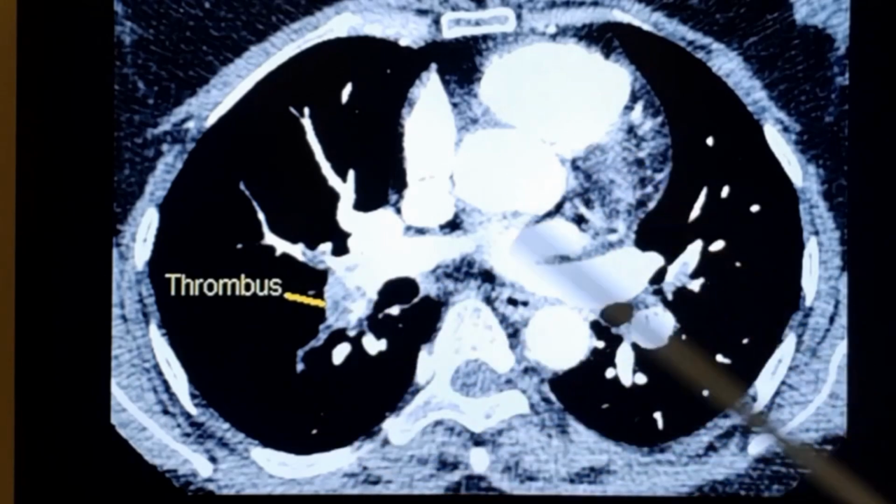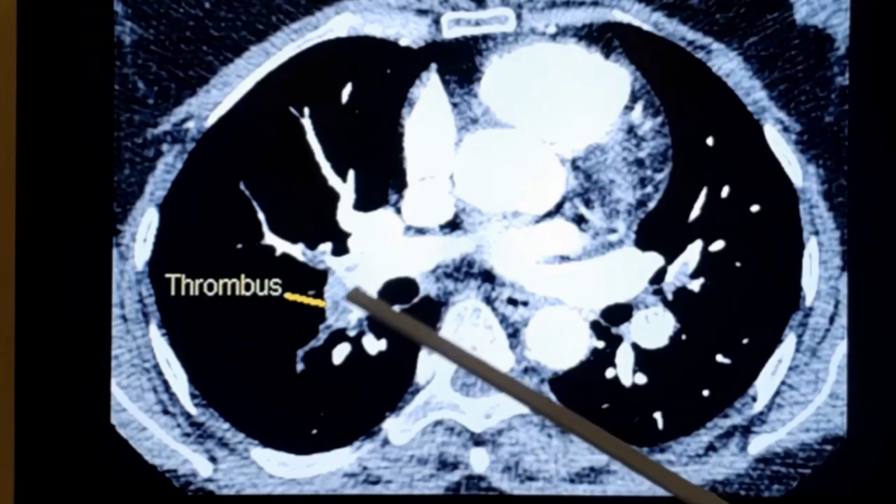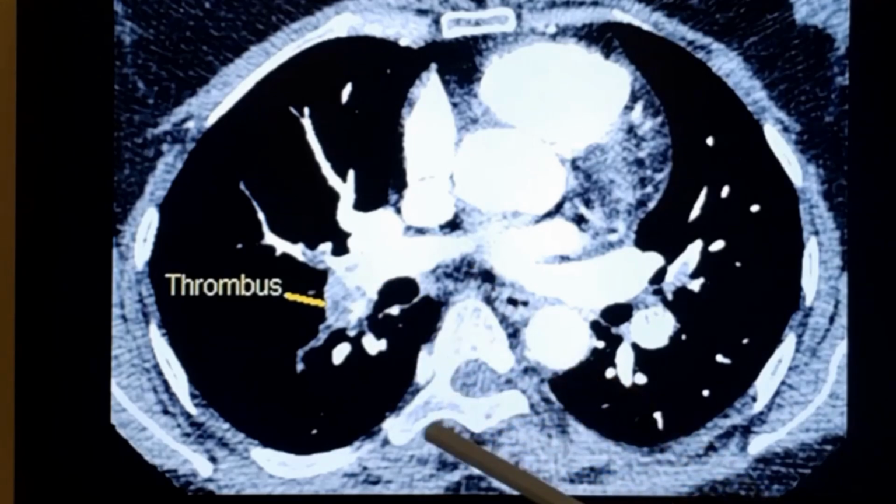So this is a case of probably venous thromboembolism with pulmonary embolism. Rarely this could also be in situ thrombosis in a pulmonary artery branch, but that is uncommon. CT pulmonary angiogram is quite sensitive and as mentioned is the gold standard for the diagnosis of pulmonary embolism. In fact, if CT pulmonary angio is negative, you can almost safely rule out pulmonary embolism.